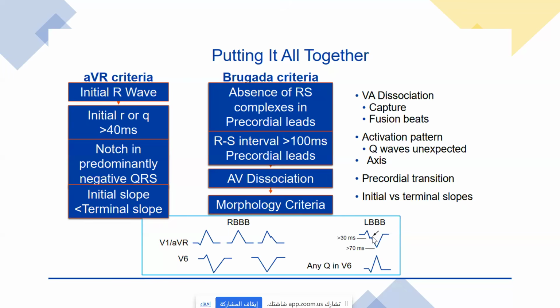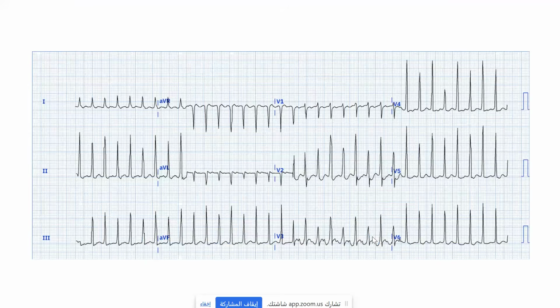So from here, let us start our practice session. In this session you will find different ECGs, and I need attendees to volunteer to read the ECG. Please introduce yourself and then read the ECG. Let us start, for the sake of time.